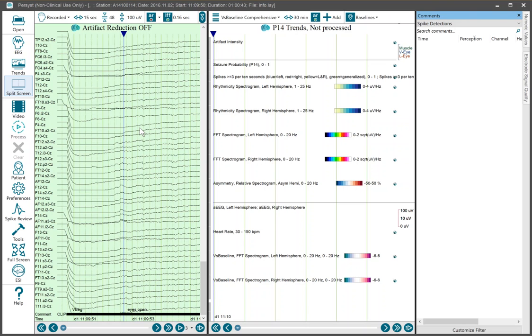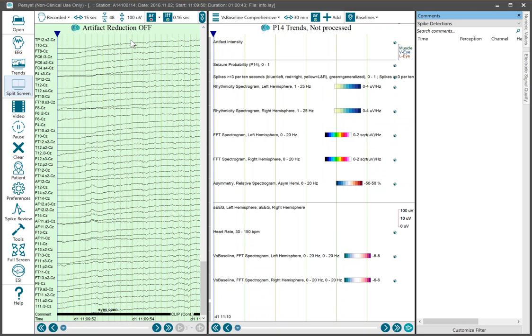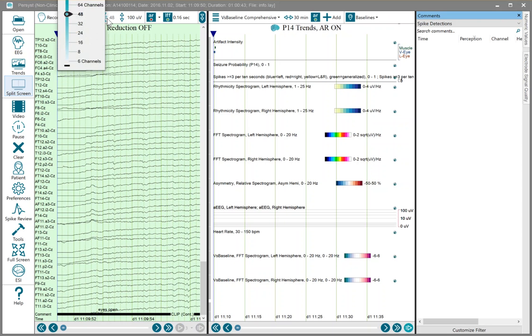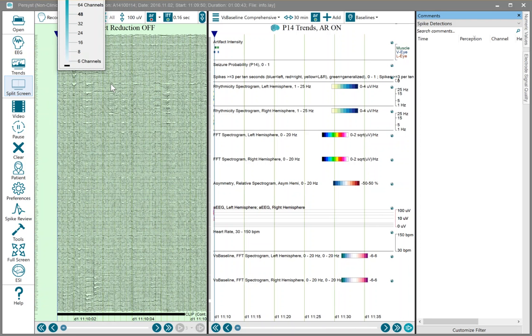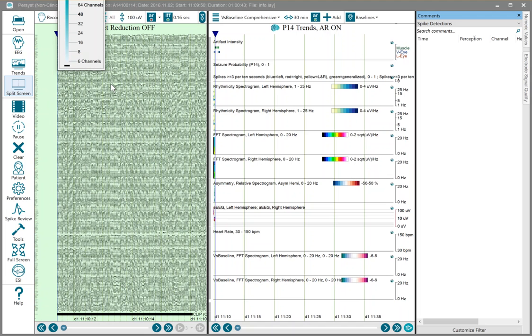And then we'll click process, and the recording will begin processing. Now, of course, a lot more data here. So the volume of channels, of course, is multiples of a 1020, and it will take a little bit longer to process this than it would. You'll see the paging speed for processing will take a while longer.